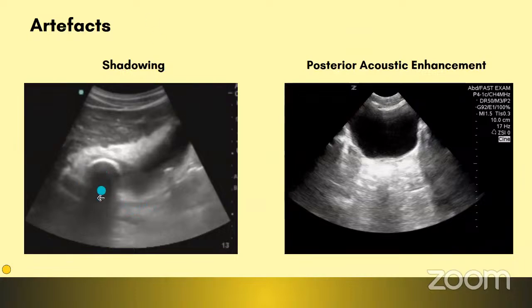As I told earlier, sound travels much faster in solids, however slower in air. Since there's increased time for the ultrasound pulses to pass through it, there's a high chance that it would attenuate much quicker than passing through semisolids. So it also produces shadows here, as you can see in this image.